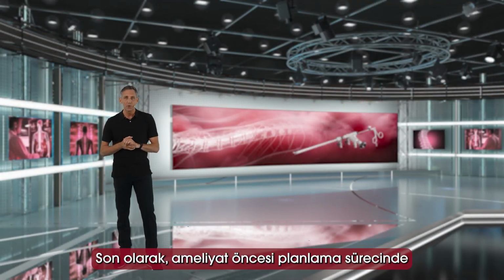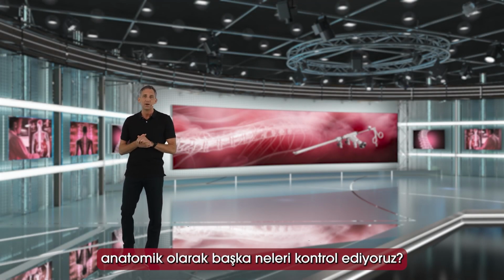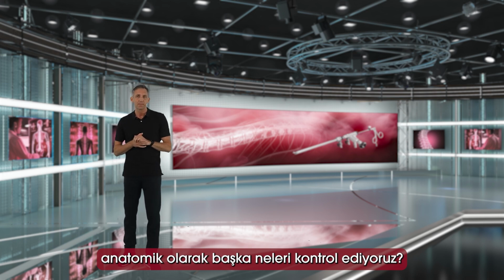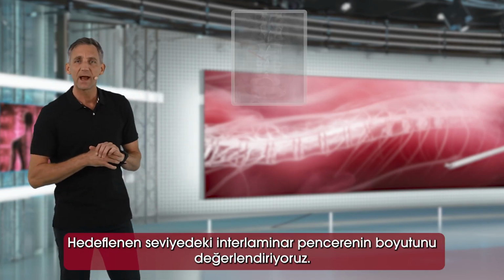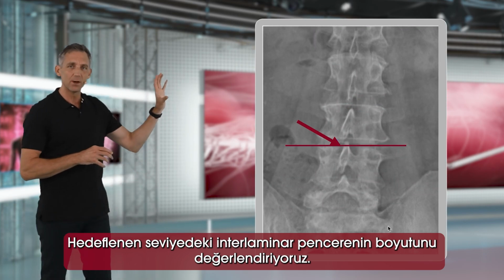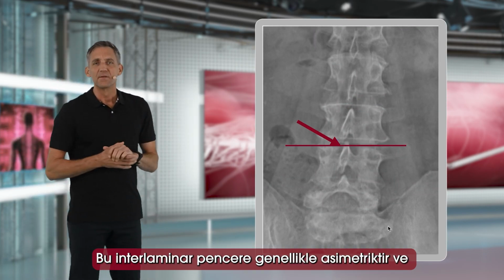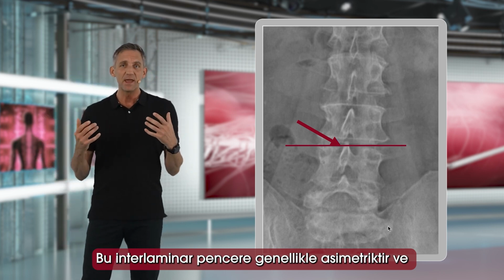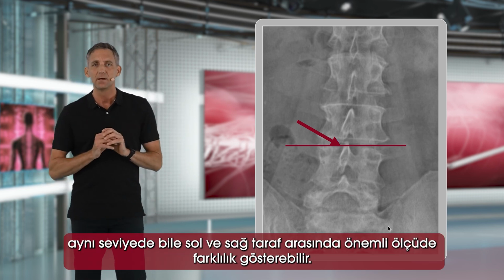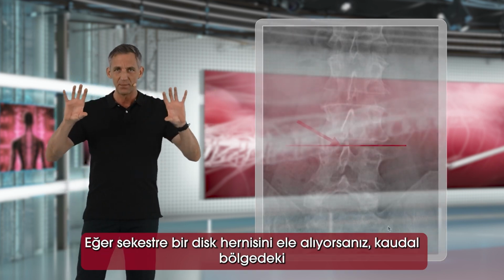Just some more anatomic considerations as part of our preoperative planning. What else do we check prior to the surgery? In the AP view, we look at the size of the interlaminar window at the targeted level. This interlaminar window is often asymmetric, and it may vary significantly when you look at it between the left side and the right side, even at the same level.